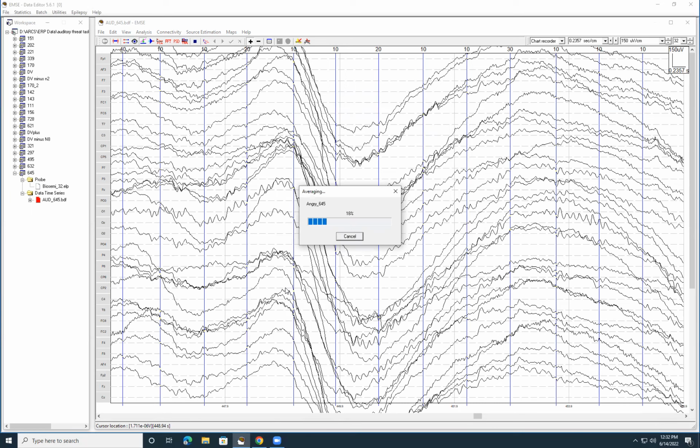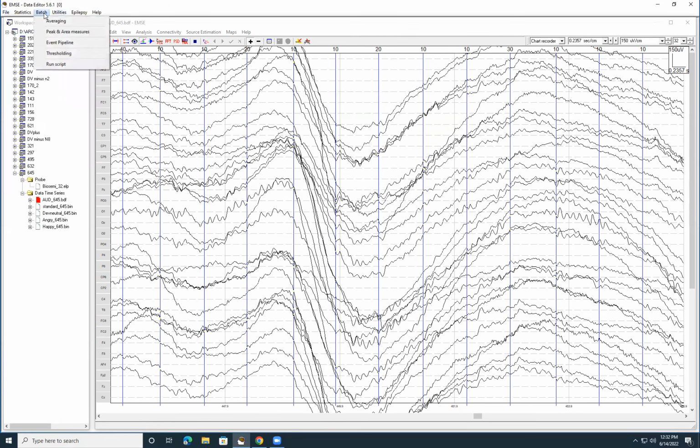And basically the difference is that the one that has the 120 in it is more conservative. It's going to throw out more trials. And the reason why we've done this is because the data that we're generally getting from auditory threat participants is so good that we can be pickier with which trials we allow in versus which ones we exclude. And we don't have that same luxury with ARCs because there aren't nearly as many trials in the ARCs task as there are with auditory threat tasks, because we basically have almost a continuous stream of trials because there's so many sounds that the kids are hearing.